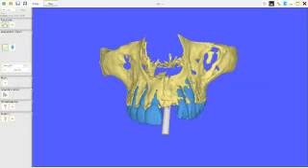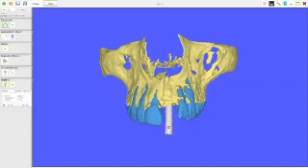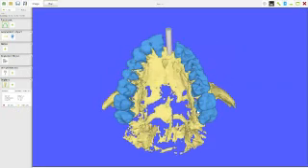So basically this is in the wrong position. This is going off. So if I turn it with this little wheel, I can move it and bring it more in line with everything. Yeah?